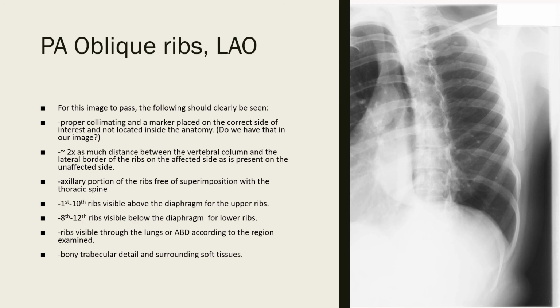There needs to be more rotation because it does not look like the patient is rotated 45 degrees. The axillary portion of the ribs is also not able to be clearly seen because it was clipped. This image definitely calls for a repeat in order to be deemed a usable diagnostic image. This is why it is important to keep a pocket Merrill's on hand during work so that you can understand whether or not your image is going to be accepted or rejected.